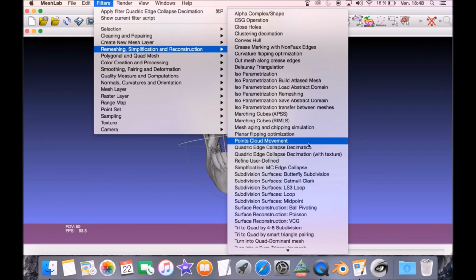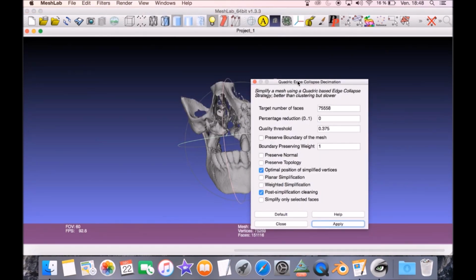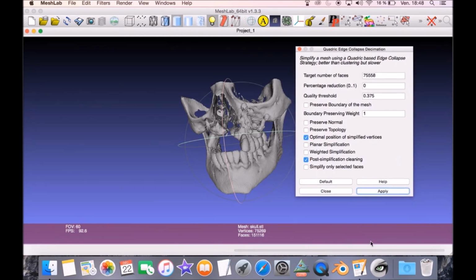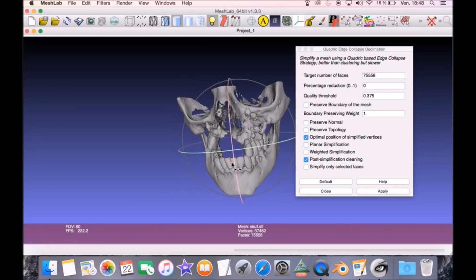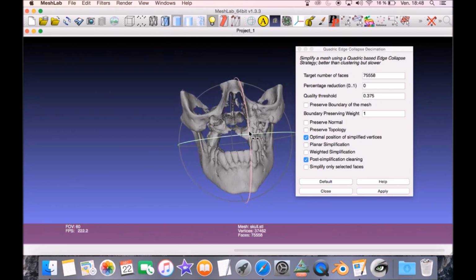So basically, by just experience, I recommend for this number of mesh to do it again. Unfortunately, you have to open it again with a filter, etc., as you can see here, but the number is already there. You apply, it's way faster. Really, there was a slight change, but the object is really perfect, and now it's really lighter, at least 10 times. And that is all the purpose of this software.